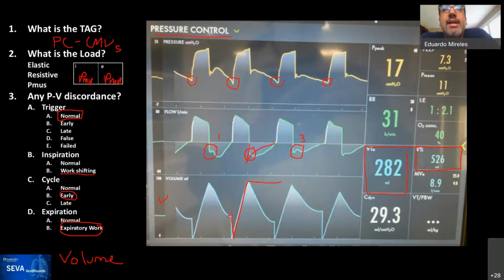It may, as this is at the end of the airway, depending on the location and how big the hole is, these leaks continuously are putting air out. And evidently, as you pressurize the system to deliver an inspiratory breath, the system will be exposed to higher pressure. And I believe that's part of the rationale of using high frequency oscillations so that you keep a mean airway pressure. You can inflate the whole lung and not have to expose it to the high pressure events to try to heal the hole that has generated.